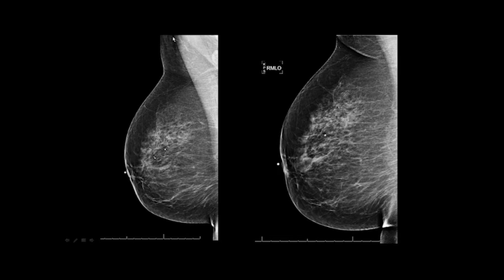It's wide superiorly with the convex border down to the level of the nipple. You can see the calcifications are very sharp. It has good compression on it. The IMF's on there, a little tiny fold here, but it's much better than here.